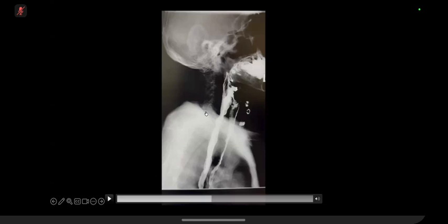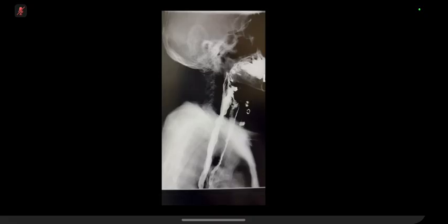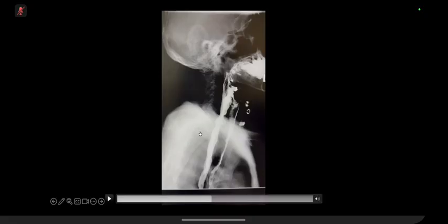This case is particularly out of the box. Out of the box means that if the patient is old age, try to rule out the possibility of a stroke, which can lead to such kind of appearance. So there is a brainstem stroke, a lateral medullary syndrome, usually associated with reduced muscular supply of the epiglottis because it affects the vagus nerve. And then the patient can be having aspiration.